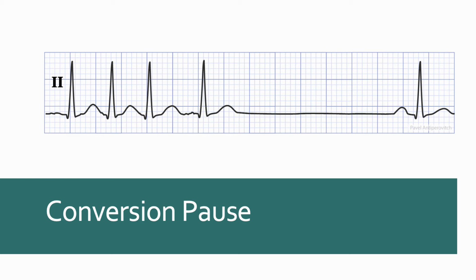So the sinus node did not kick in when it's supposed to after being bombarded and being in atrial fibrillation. So as before, this is a sinus node dysfunction problem. This is not like an urgent thing that you need to rush the patient to the hospital for. However, it can be symptomatic, and these pauses can be quite long.